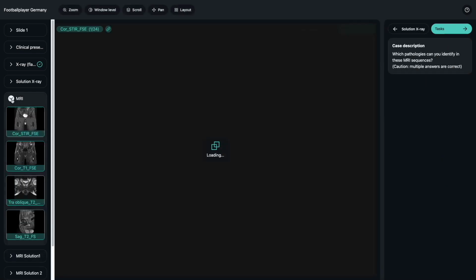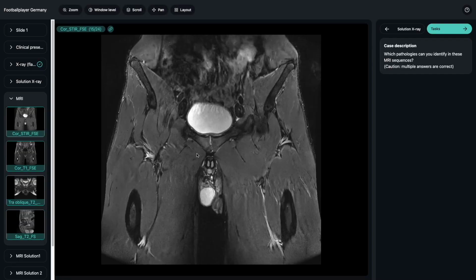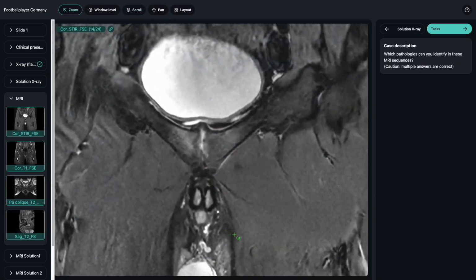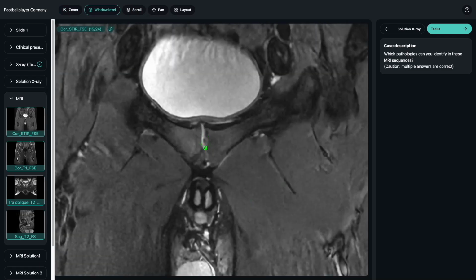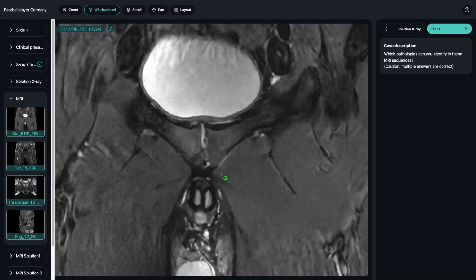In addition, our patient also shows so-called cleft signs. Cleft signs are microtears at the adductor insertions of traumatic origin, which are connected to the physiological symphysial cleft, also called primary cleft. Depending on the location of these tears within the different tendon insertions, we distinguish secondary, superior, and, when both are present, so-called complex cleft signs.